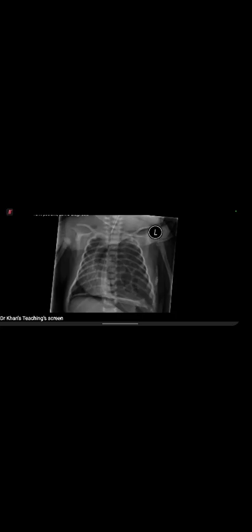If you can see along this rib, intercostal region, and now if I zoom it, you can see this sort of line along the thorax. So that is where the air, the pneumothorax, has happened, and then it's tracking through the hernia into the peritoneal cavity. So that's the diaphragmatic hernia with pneumothorax. Okay, perfect. Thank you very much.